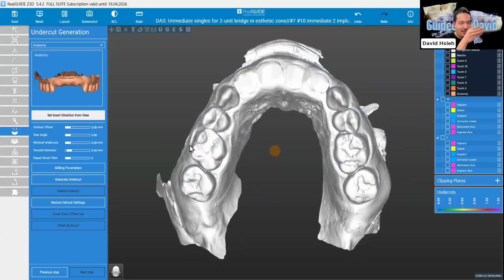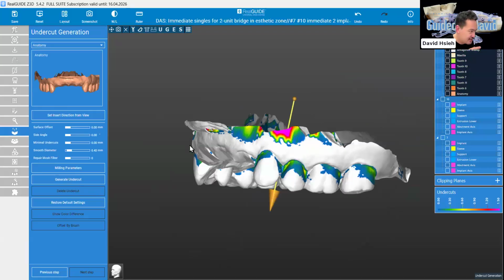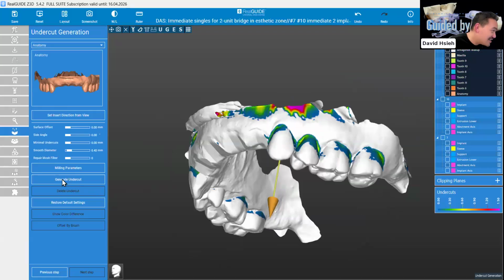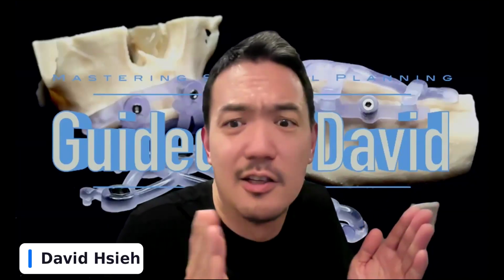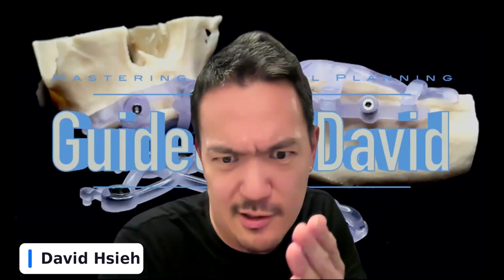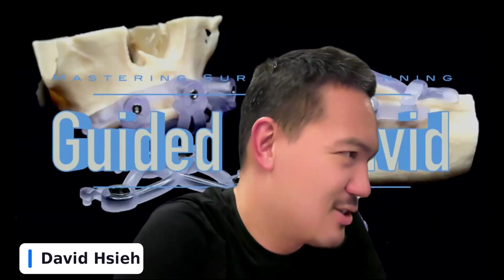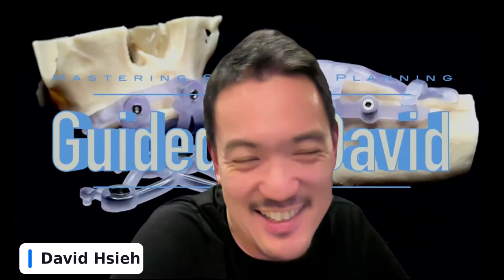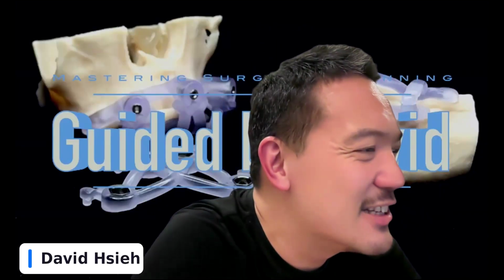All right, so this sets the path of insertion from the view, and then you can see the colored side is the undercut. And the beauty of the digital tool is, if you hit generate undercut, it will just generate an undercut model. Oh, see, the software just died, right? Oh my god. Okay, so let's just jump right back in. So there's a reason I hit save, right? In the digital world, that could just happen. All right, just go back in. I knew that was gonna happen. And that happened, sadly, right? So let's go back in.